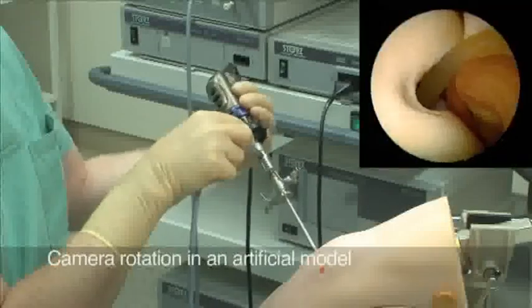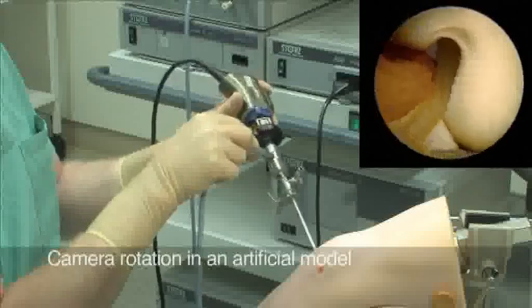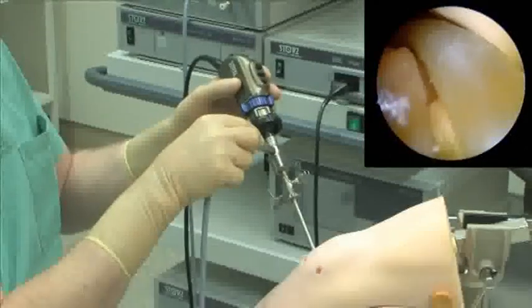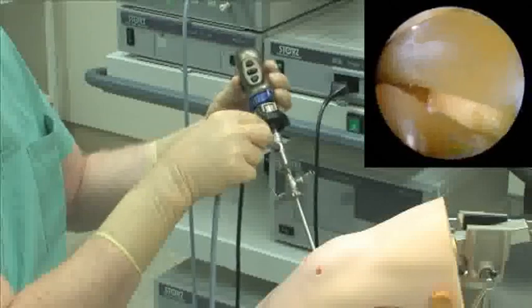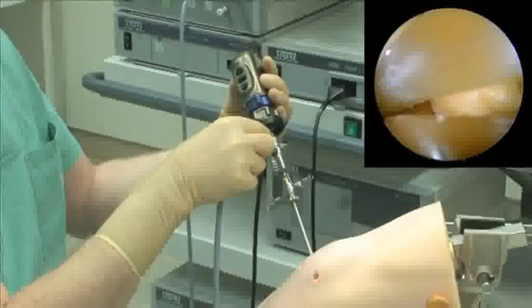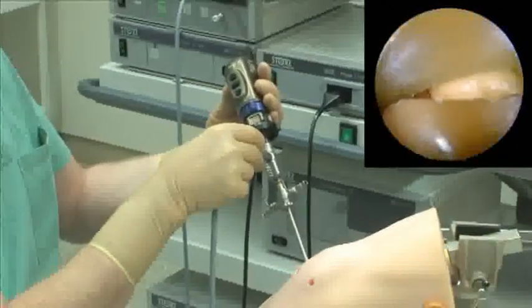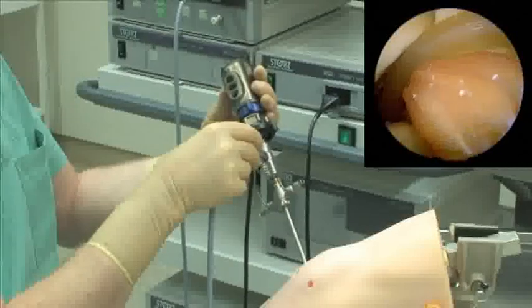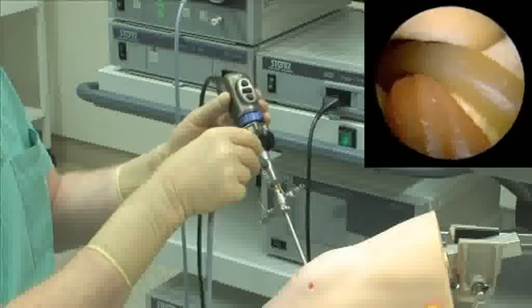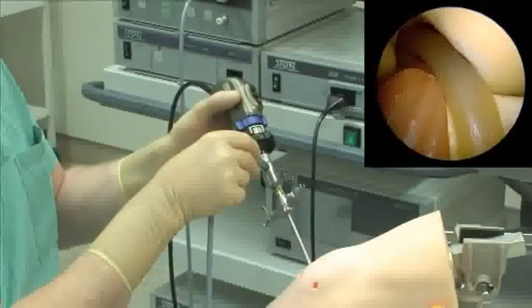Positioned in an artificial knee, camera rotation can be controlled using the monitor image. If the tip of the endoscope lies very close to the anterior cruciate ligament, ACL, we don't have a sufficient field of view. Turning the camera leads to a complete loss of orientation. In such a situation, we retract the endoscope and turn the camera until the view of the ACL is correct on the monitor. The light cable is not moved.